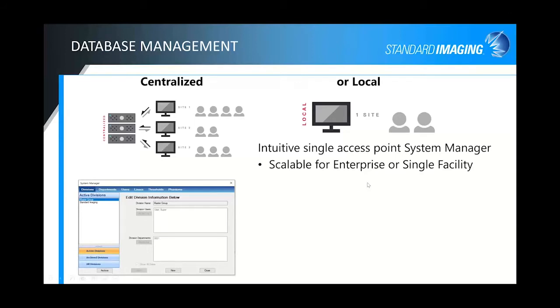For some reason, my PowerPoint is being kind of wonky today, but very easy department setup, which I'll get to in a second. Basically, we have the ability to set up our system manager, and you'll see it's divided up into divisions, departments, users, LINACs, thresholds, and phantoms.